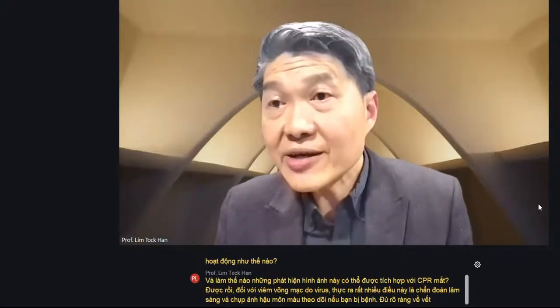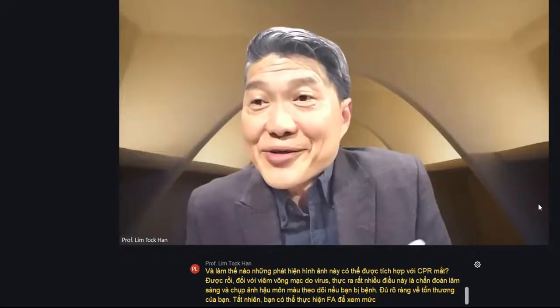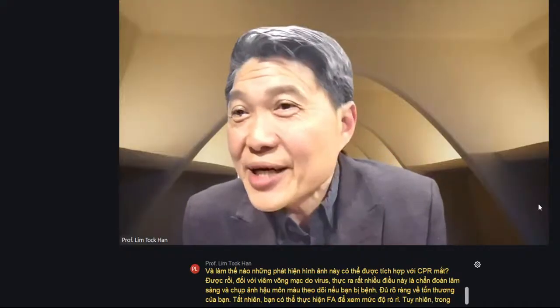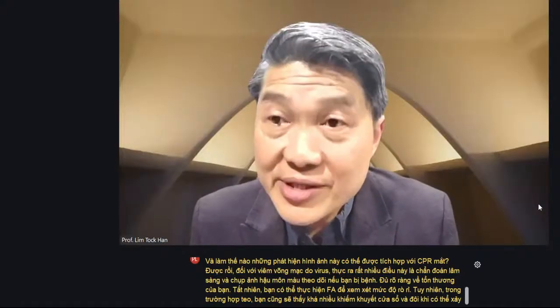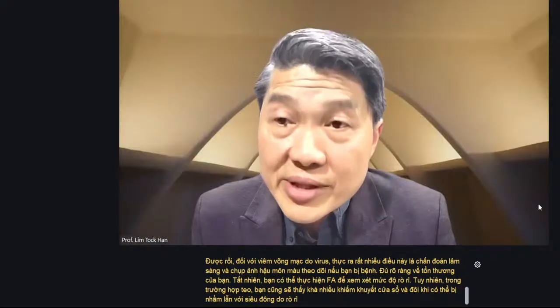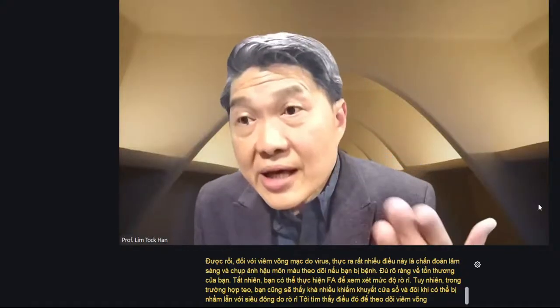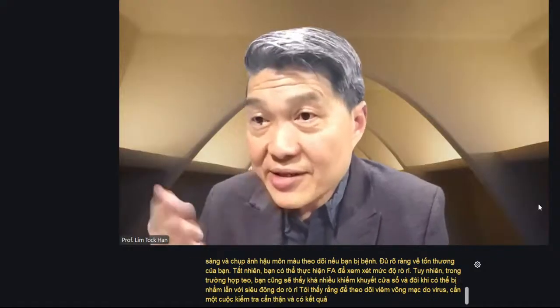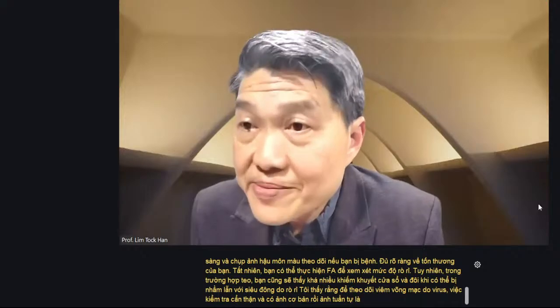Of course, you can do FA to look at the degree of leakage. However, in the atrophic cases, you would also see quite a lot of window defect, and sometimes it can be confused with hyperfluorescence due to leakage. I find that for monitoring of viral retinitis, careful examination, with a baseline photo and then sequential photos, works very well to guide antiviral treatment.